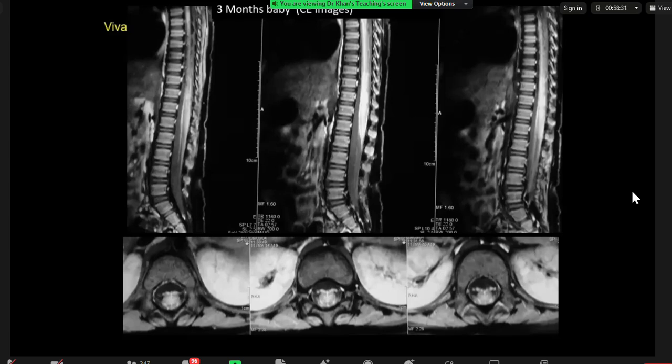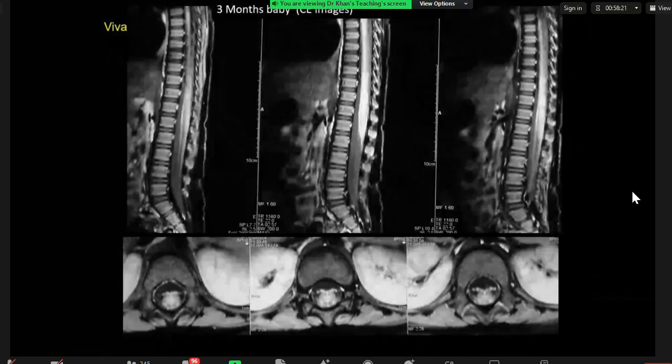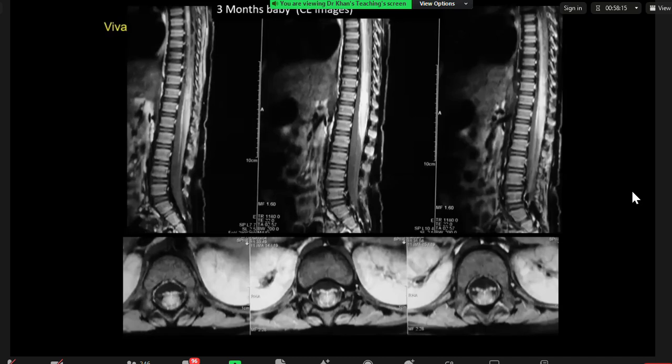No, actually, is it displacing the cord? No, sorry, I'll take my initial assessment back. On the imaging, it demonstrates the cord signal. The cord itself is enhancing homogeneously throughout. Excellent.